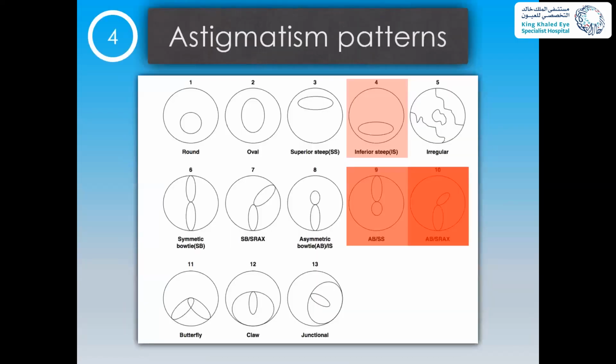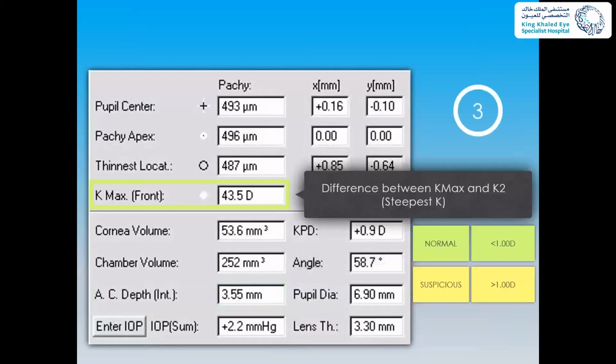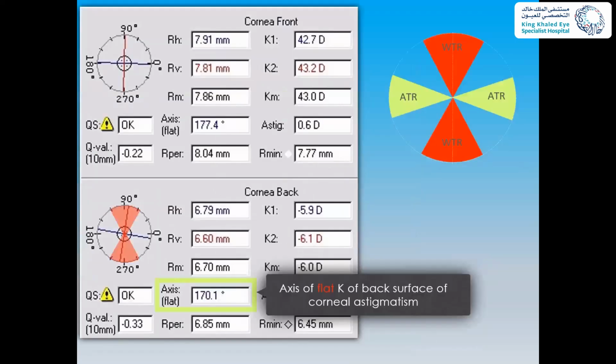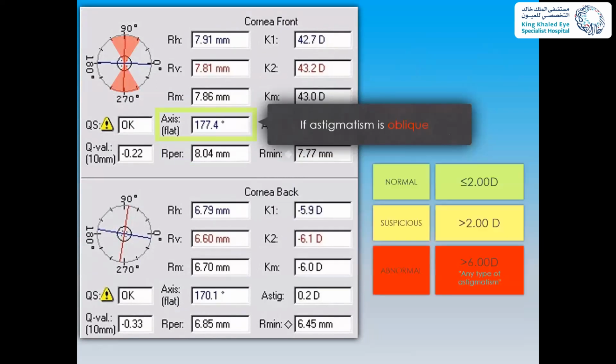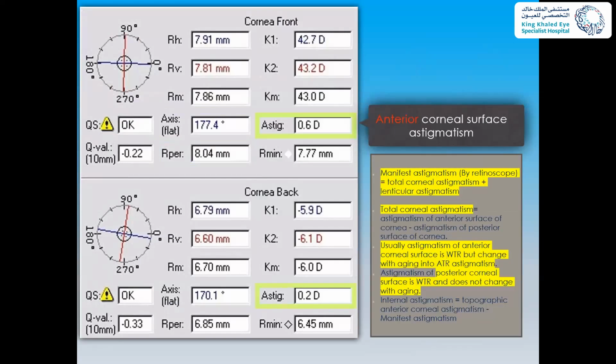So progression of the keratoconus, you look from the 4 maps and you look for anterior elevation, posterior elevation, K1, K2, and the thickness. Basically it talks about refraction: half a diopter change in the refraction, half a diopter change in the astigmatism, half a diopter change in K2 if it is increased, more than 0.75 diopter or maybe 1 diopter in Kmax. Kmax is not accurate because Kmax is usually peripheral, and certainly if you are using a sagittal or axial map, and if there is a slight misalignment, the Kmax will be increased.